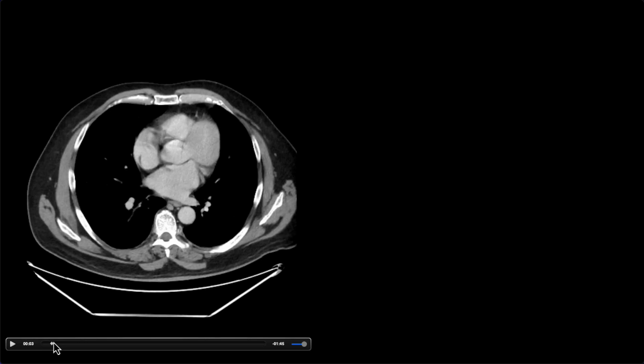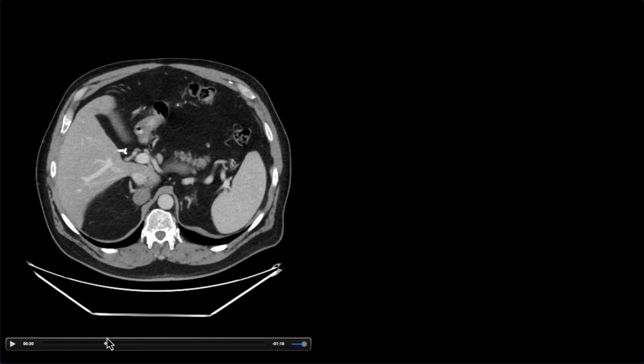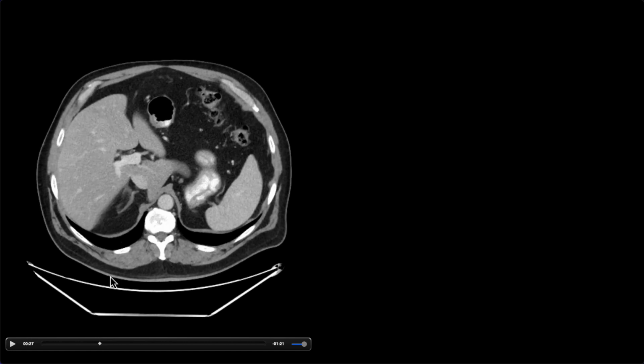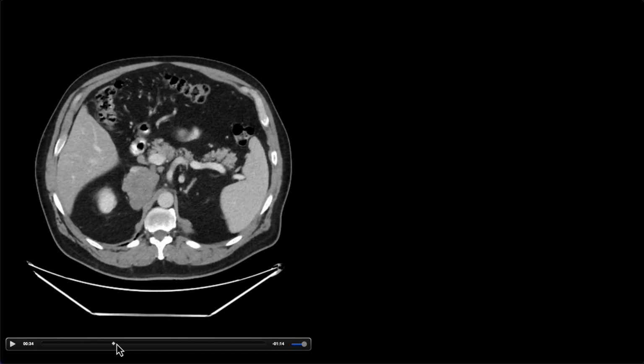For our next companion case here, we have another lobulated retroperitoneal mass, and we can go through our checklist. This time, it does look like that right adrenal gland is relatively spared, although the lower margin we kind of lose it a bit, but it doesn't look really centered on the adrenal gland.